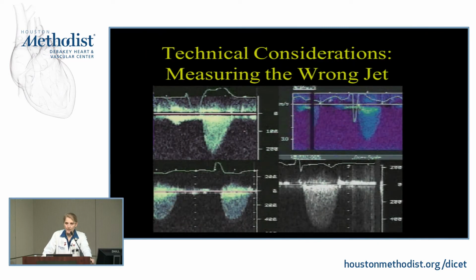Now, as aortic stenosis progresses, basically the systolic ejection period prolongs, and there's a delay to the peak of the stenotic jet, which is that pulsus parvus et tardus that you feel on exam when you're palpating somebody's carotids and listening to their murmur. And it can become very difficult looking at those blind PEDOF signals to determine which one is actually the stenotic aortic jet, especially if the patient has multiple valvular lesions.